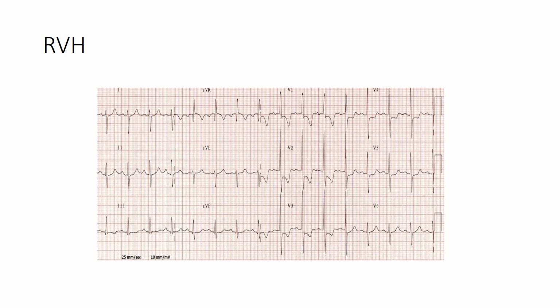Here also you can see by seeing the leads lead 1 and lead 3 that there is right axis deviation.